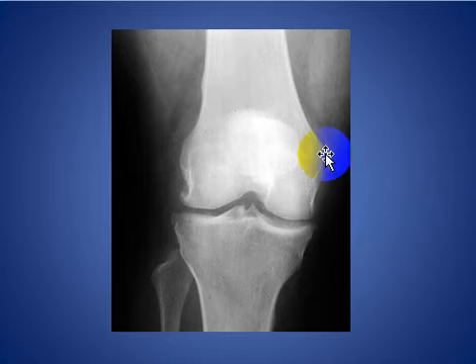Here there is a calcification of the medial collateral ligament due to chronic injury, and this is called Pellegrini-Stieda sign.